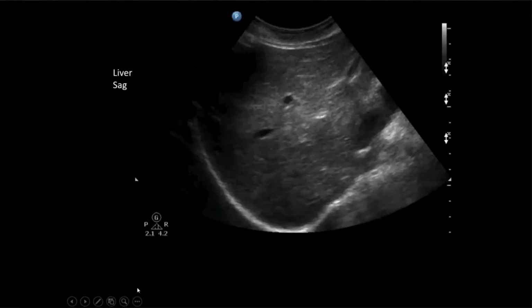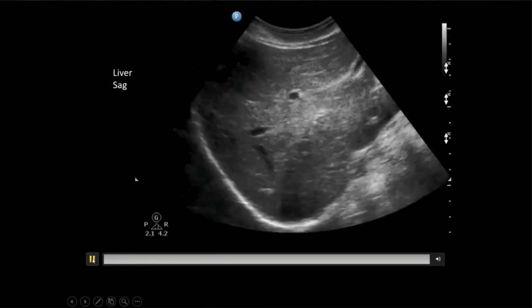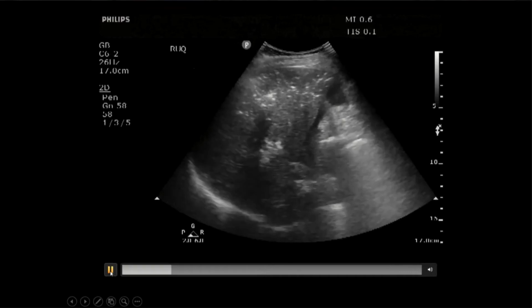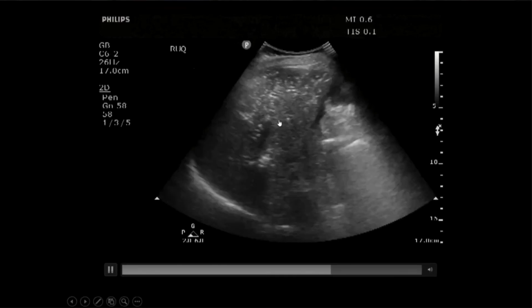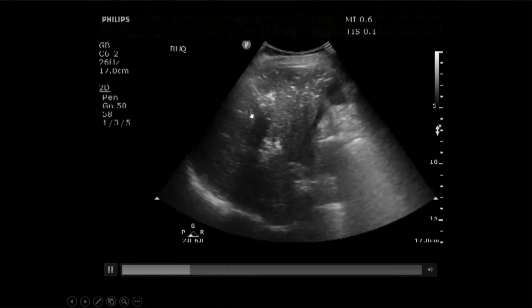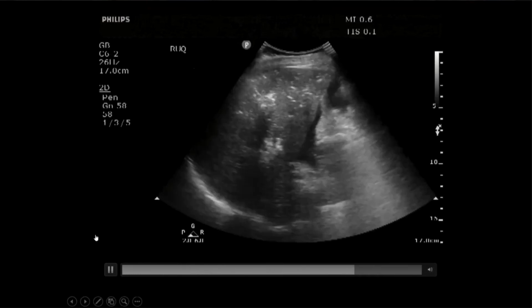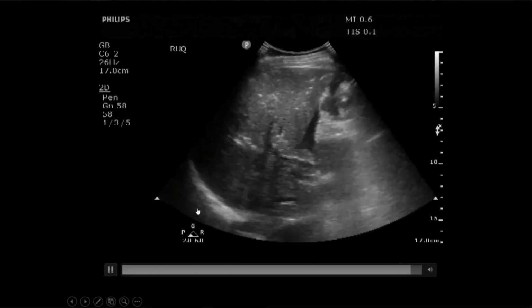All right, so back to our nice normal liver. What's next? Oh yeah, okay, so our nice kind of normal liver. Then what about this liver? What do you notice? What's like all of this stuff? Bright echoes, dirty shadowing, air. Exactly. Thank you, Matt.